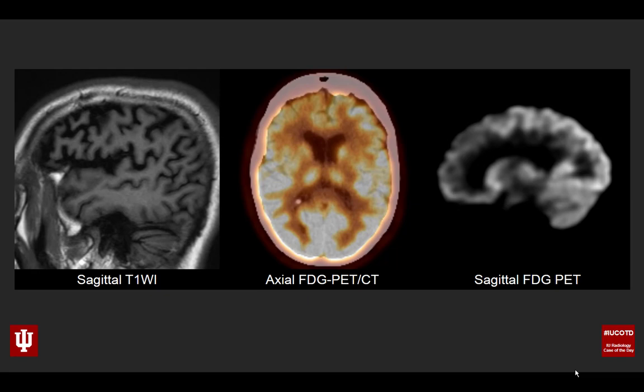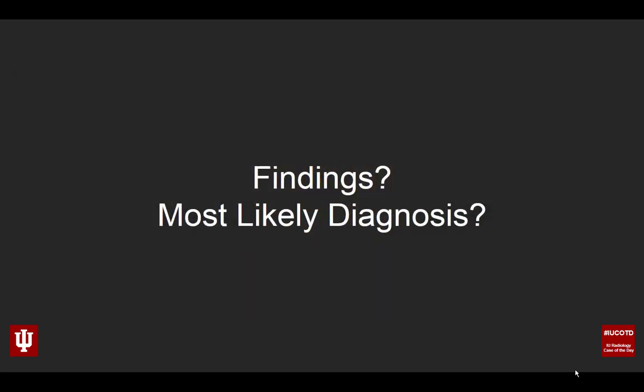So keep in mind the clinical history. Take a look at these three images. Tell me what you think is going on here. Okay, so what are the findings? And what's the most likely diagnosis in this case?